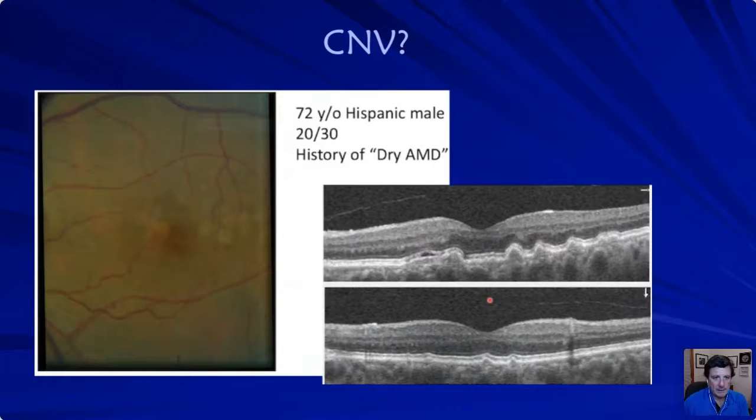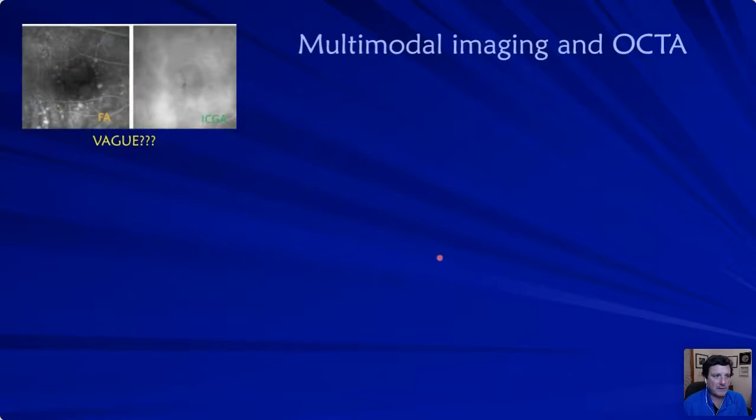And how about this one? You have this patient come in. You have drusen, large drusen. This is a very sick RPE. You could see these pigmented epithelial detachments, what we call drusenoid pigmented epithelial detachments. Very large, numerous, maybe a kind of hyper-reflective foci forming here. But, you know, this fluid maybe, so we decided to run the angiography on this patient. So these drusen here are in this image. Ran the angiography on this patient.